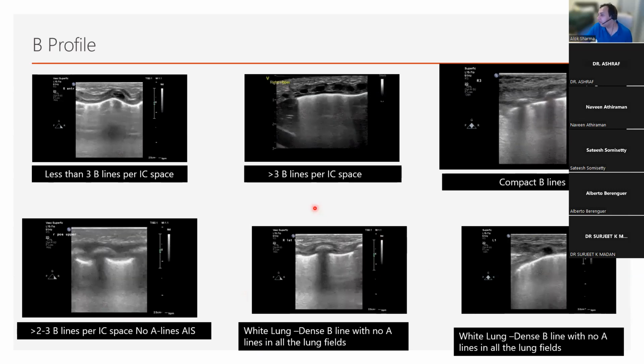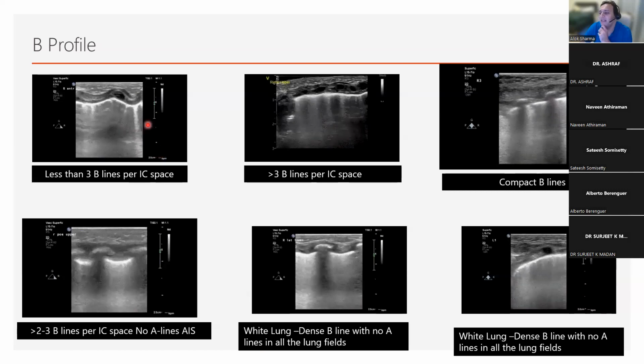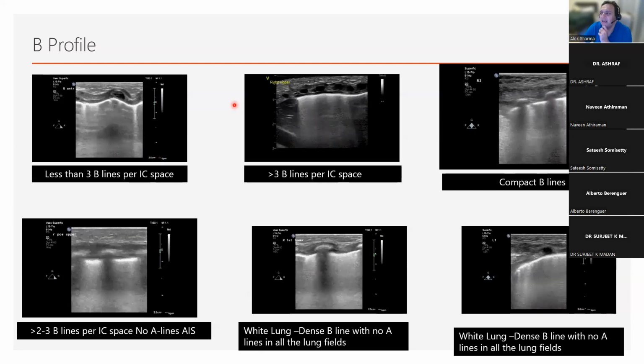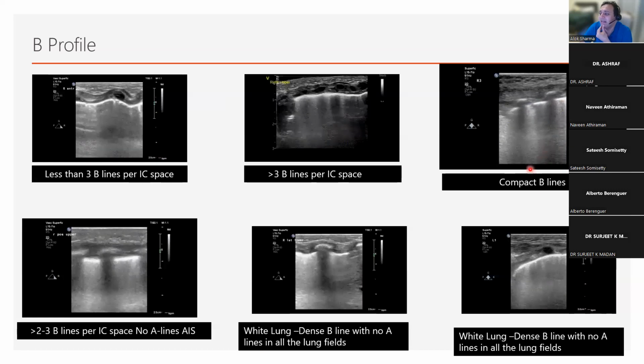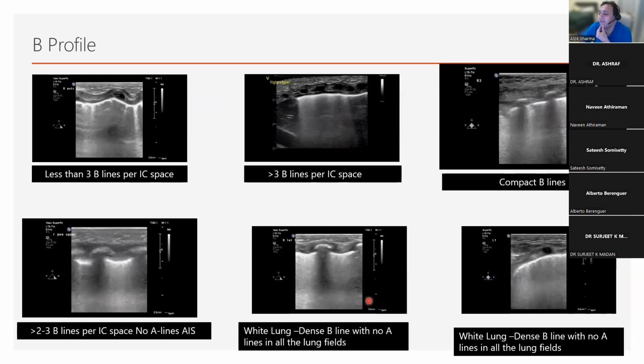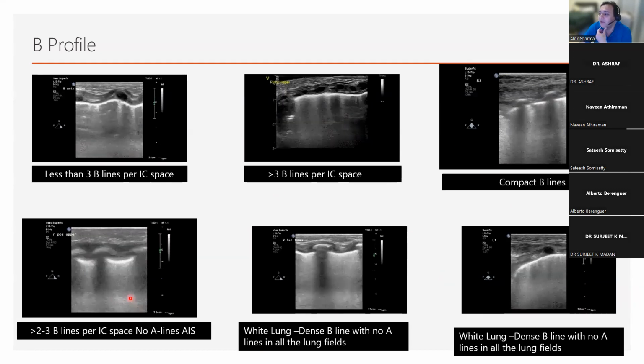So again, can you see how transition can take place? Now, if this was the same baby, and I told you that this is a preterm 24-weeker who's now coming to 10 days of age, whose ventilation is going up. Really, this was after surfactant. This is day 5, 6. This is day 8, 10. Then a real question that I would be asking myself is, is this baby evolving into chronic lung disease? But the other potential in this situation is whether the baby's got a duct with a significant left to right shunt, because that will give you this kind of progression.